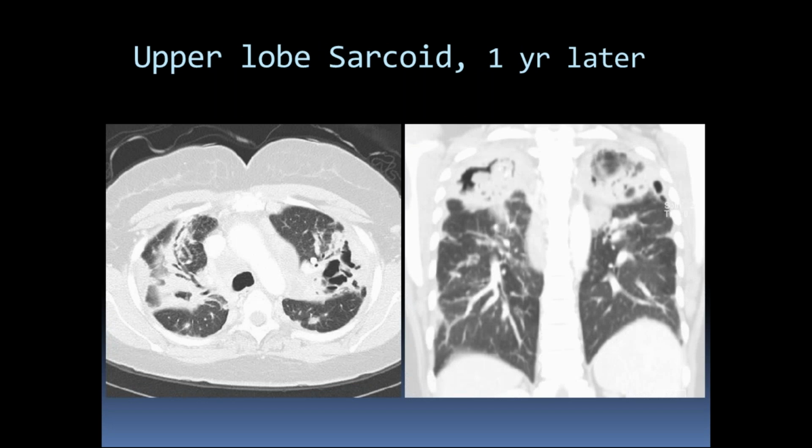Well, one of the things that happens in sarcoid when you get these cavitary things, and actually many cavitary lesions within the lungs, is that things like to colonize that open space because patients are immunocompromised. They can't deliver all the immunology cells in order to fight off infection and everything. And what happens is it gets colonized by Aspergillus. So this one year later, the sarcoid advanced a little bit, but got colonized by the Aspergillus within that cavitary lesion.